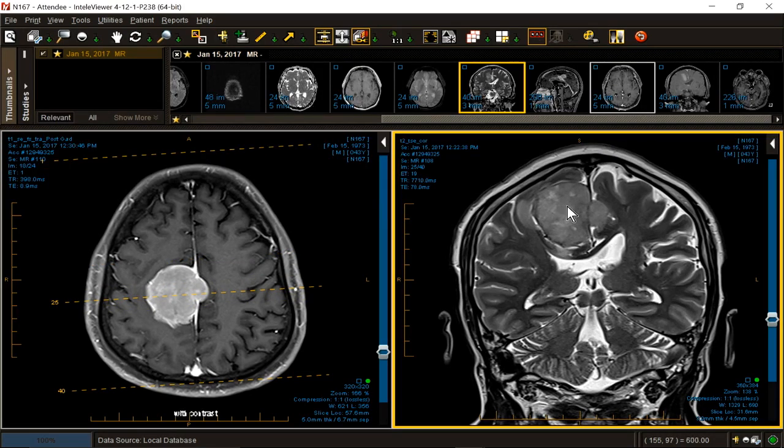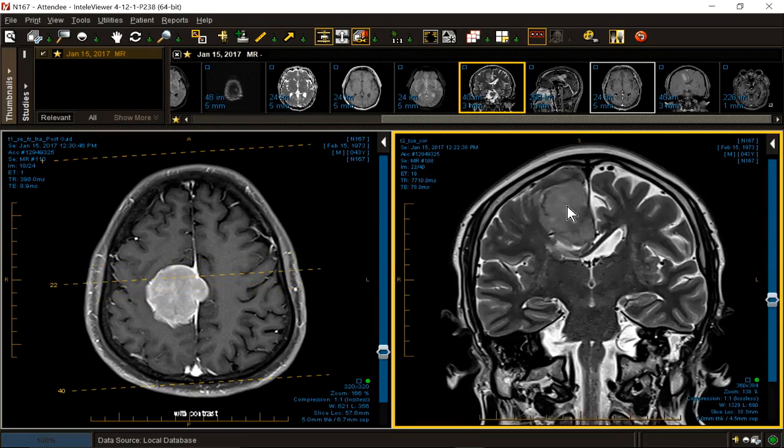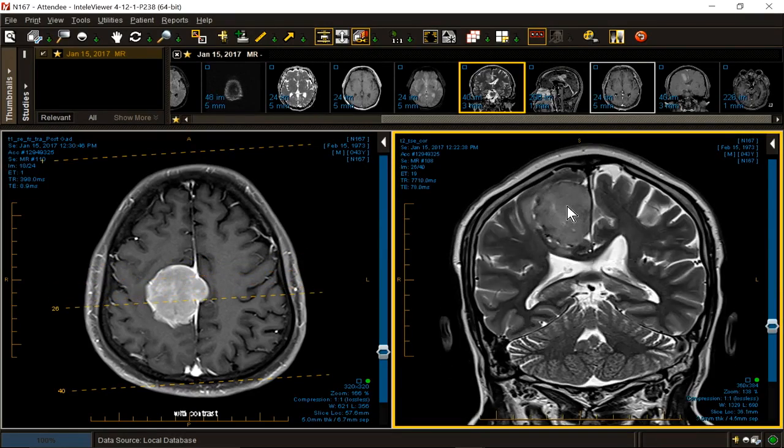The enhancement is early. They're like your mother-in-law or father-in-law. They come early and they stay late. The so-called in-law sign. I know about that because I'm an in-law.